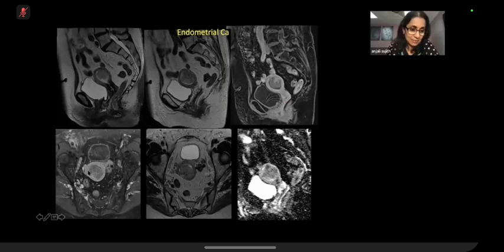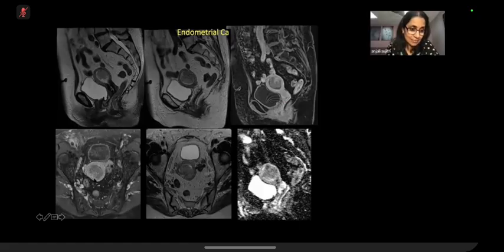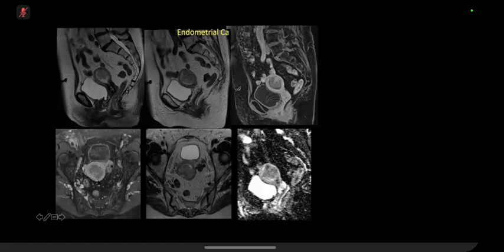Okay, let me help you here. Sorry, I was going to say, I think that there is some myometrial invasion, but it's... Good. I'm trying to decide whether it's more or less than 50%. I think I'm going to go with more.